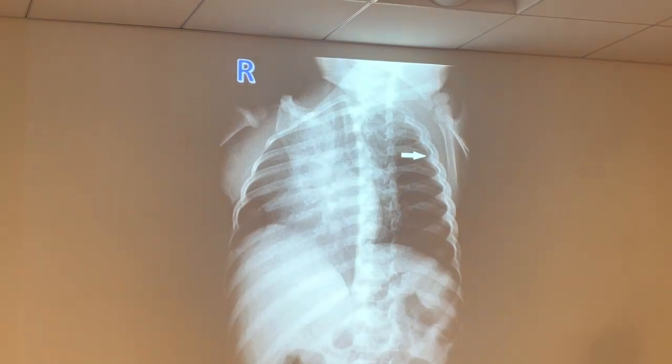What is this? RPO. But why is it RPO? Is it the same side? Right side is marked and the right side's down, it's also elongated, thus it has to be RPO. Is the right arm up? Is it clicking, guys?